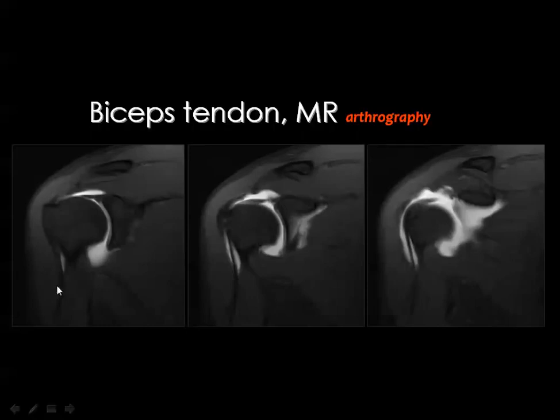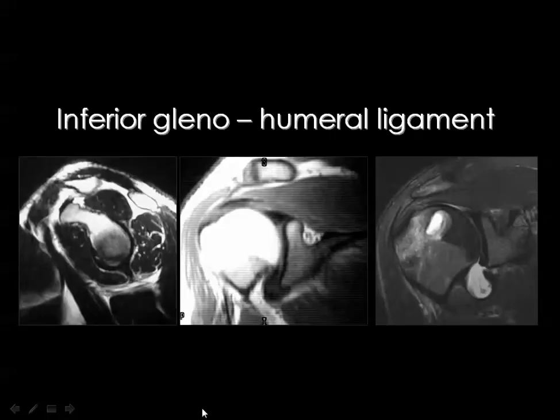And you know that this tendon will cross inferior to the supraspinatus tendon, which is this one, inserting into the greater tuberosity. If you look carefully here, this triangle is the superior labrum, and here you will see the inferior labrum. But the inferior labrum in many cases is not a triangle, because this does not represent the inferior labrum alone. It represents also the inferior glenohumeral ligament.